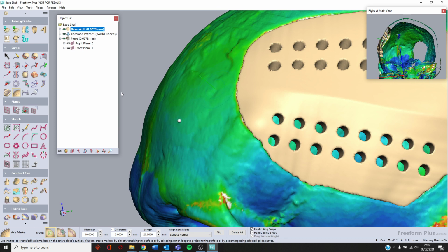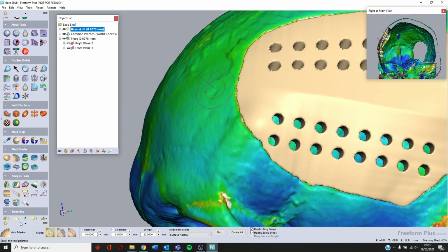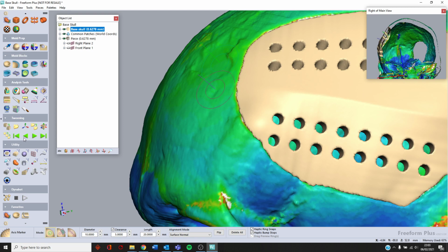So let's say I'll leave it somewhere there. And then I'll drop one next to it, and I will move around again. It follows geometry. However, what happens here, I cannot go any lower as it stops me because of the clearance that I set before. Let me just switch off the tolerance map so those will become clear.